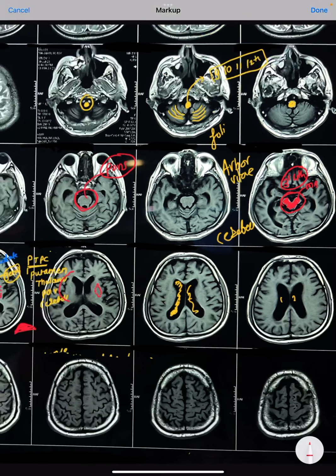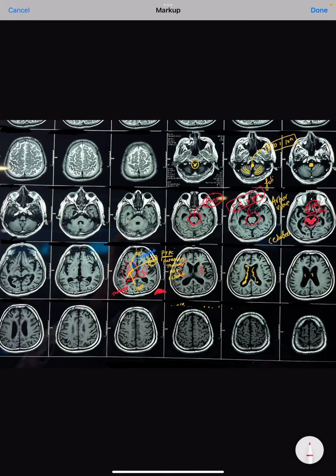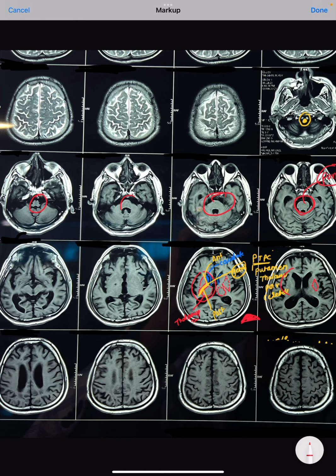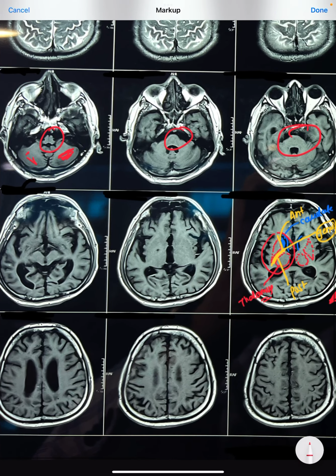nerves, whereas this pons is the origin for fifth, sixth, seventh, and eighth cranial nerves. So this way you can remember that this is pons and this is medulla. This is pons medullary junction, and just behind that, what we have is all cerebellum. These are both cerebellar hemispheres.